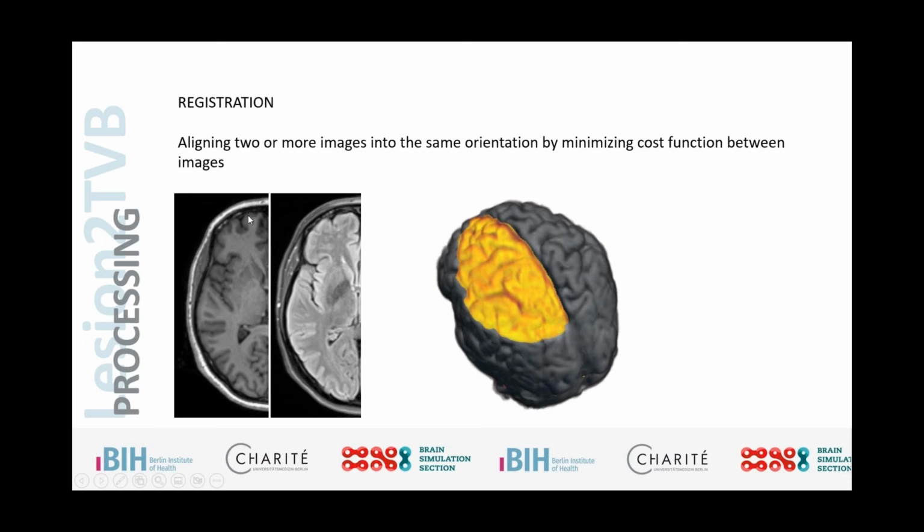So there are different aspects of how this can be avoided, and we want to end up with the perfect overlap. We're seeing here in gray the T1, and in gold overlapping perfectly the T2. I just cut out a little bit of the T1 visually here to really show the perfect match between the T1 and the T2 image. Even though this is actually a FLAIR and there's a lot of difference in resolution, we end up with this really nice overlay if we perform the correct and careful registration that we want to have.